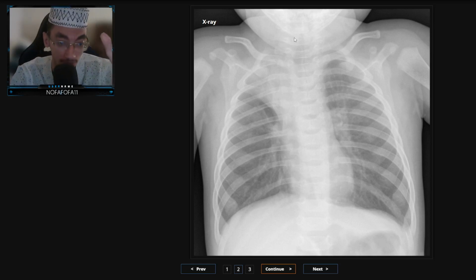If I look at the mediastinum, the structures in the middle, I can tell you right now that there's an abnormality. That abnormality being the trachea. Now, the trachea is in the middle. It's a lucent tube structure. It's a tube composed of air. So it's going to be seen in the middle as a tube lucent structure.